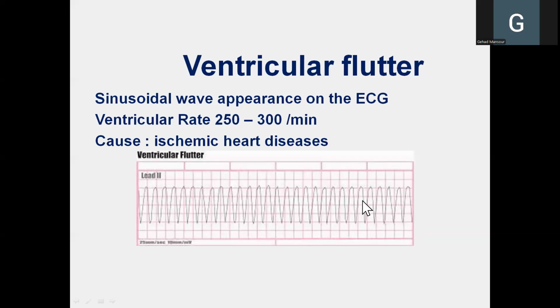Why am I saying if it were to appear here? Because it will never appear. Why wouldn't it be shown on the ECG tracing? It's because the P waves are slower in rate than the QRS complexes. And most importantly, the QRS complexes not only have a higher amplitude, but also a broader width or duration.